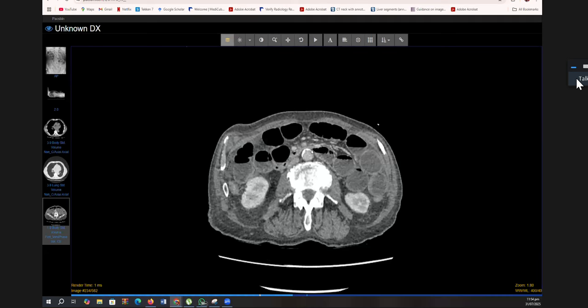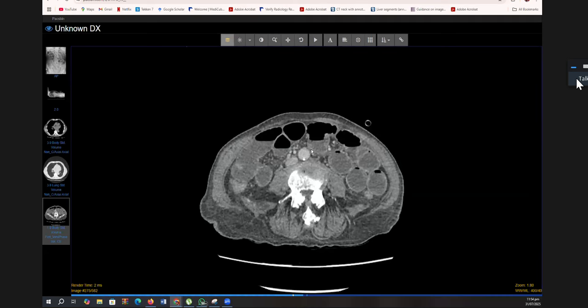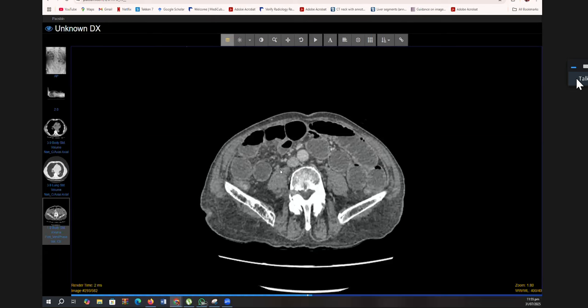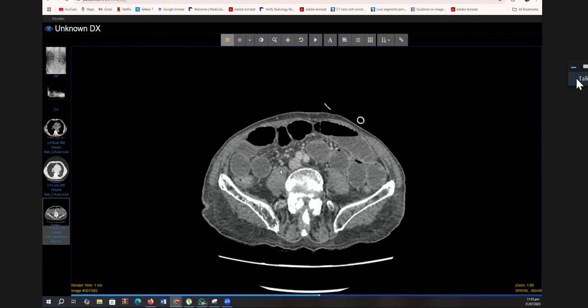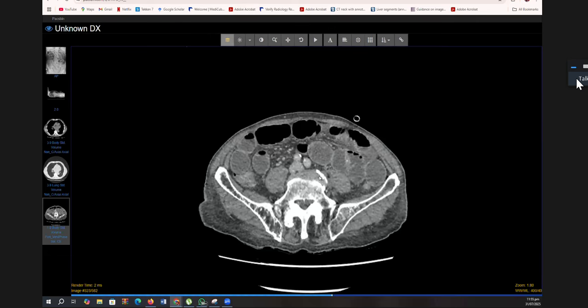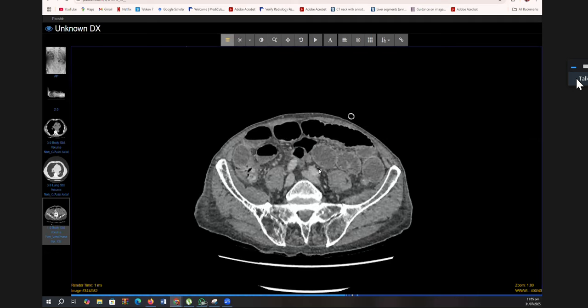So go down into the pelvis, and because hernias are an obvious cause of small bowel obstruction, it's a really good, useful tip to go and look at the groins early on, because you might see the cause of the small bowel obstruction. So scroll down.